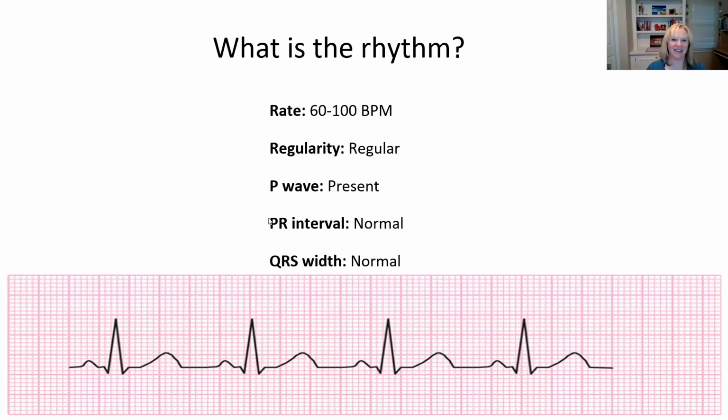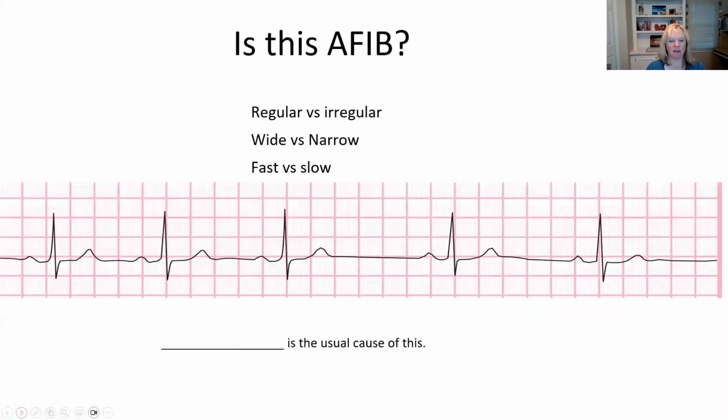Chelsea, yes, you're here. I know you meant to say P. They're so close together. So we have a P wave, we have a regular R to R, and we have a P for every QRS, and then we have a T, and that's what we like to see. So it's a rate between 60 and 100, which is also good. And yeah, this is normal sinus. So you're always hunting for this. But then you can have other things that can be confusing.